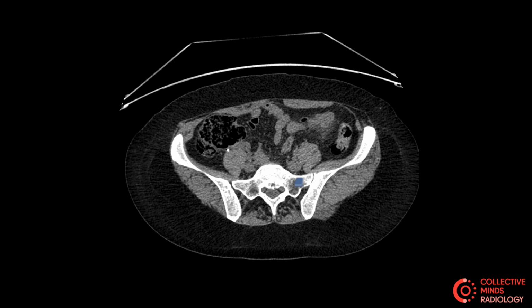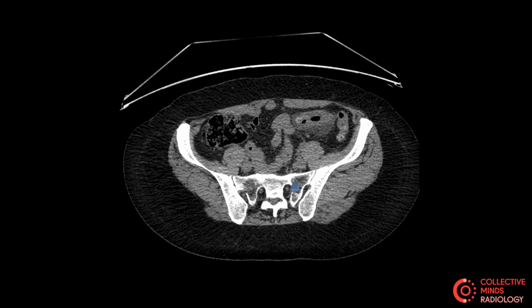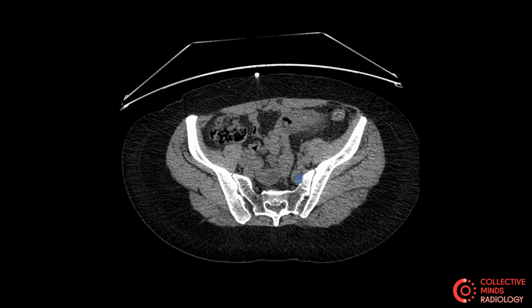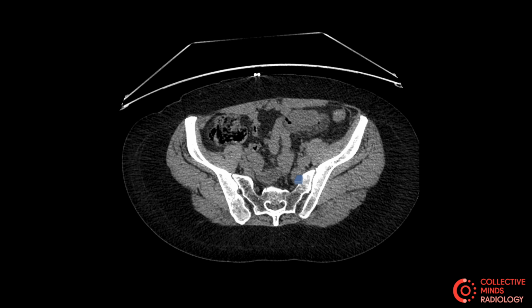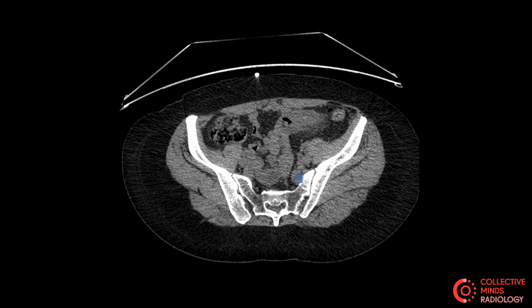ileum. But in this situation we have noticed that there is in fact some inflamed bowel located within the left iliac fossa. Not many causes of pain are located in the left iliac fossa beyond the possibility of a calculus, but there's also the possibility of diverticulitis, and this patient has actually got diverticulitis. So for the average Joe, that could be the end of the question, let's move on. But actually you've got to look and see whether there are any other secondary findings of diverticulitis.